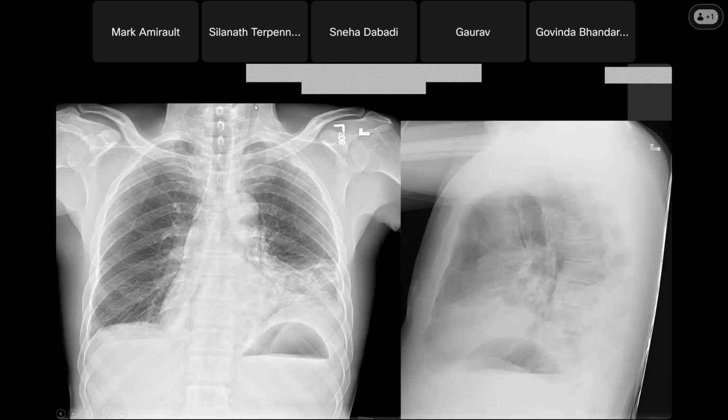When I'm looking at the spine, I notice there's this lucency here up in the neck. And that tells me there's some gas in this guy's mediastinum that's tracking up into his neck. You can see it along the aortic shadow here. So he's got pneumomediastinum, which means air in the mediastinum. There can be many different causes, but in the case of someone that's been vomiting a lot, what we worry about is a person that has ruptured their esophagus from the pressure associated with so much vomiting, called Boerhaave syndrome.